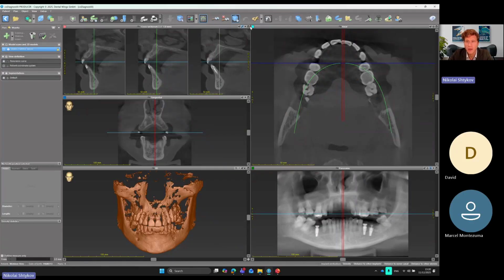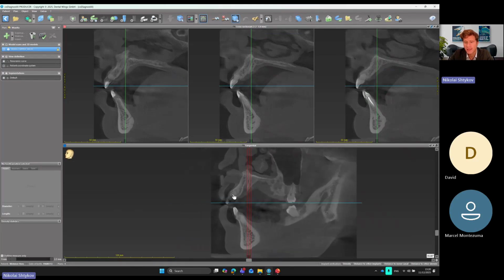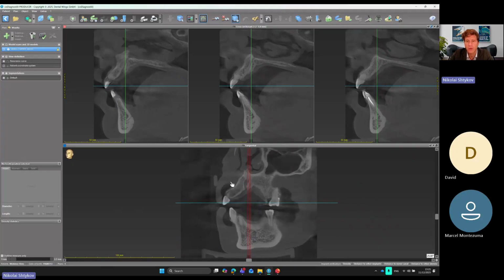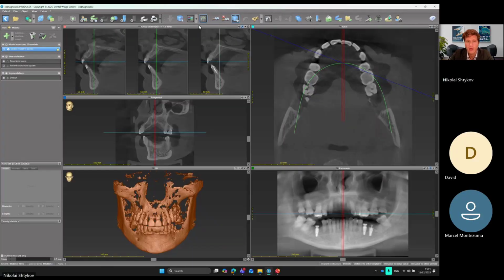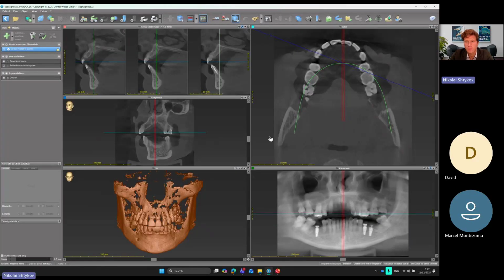Also, you can see panoramic, axial, cross-section, and tangential views. I like the view for planning in this small icon as a cross-section and tangential view, like this. And the tangential view is the view around the point. And also here I have the shortcut for cross-section and tangential.